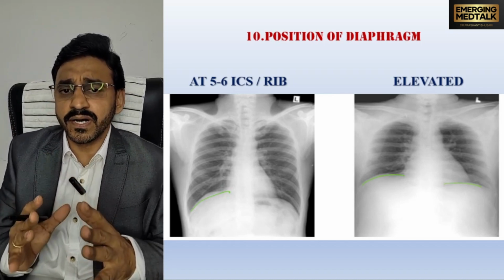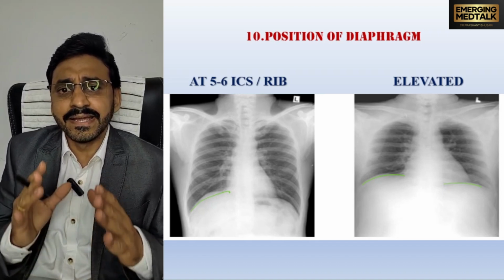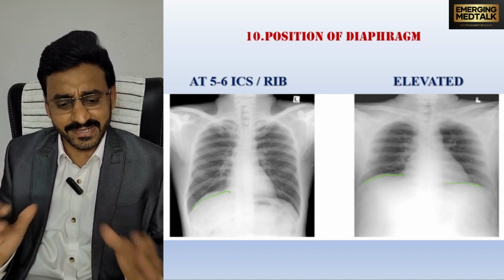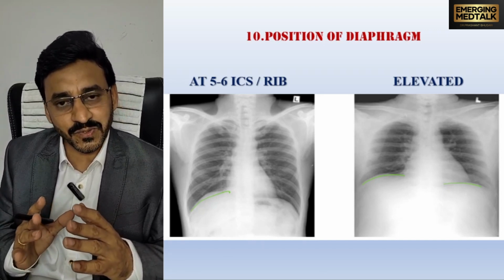So the most common one we do is the posterior anterior view, and in sick or intubated patients, the anterior posterior view is done, which is less common. And these are the 10 differentiating points between posterior anterior and anterior posterior views.